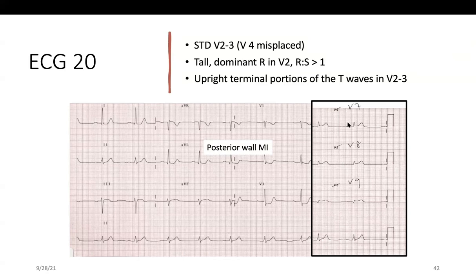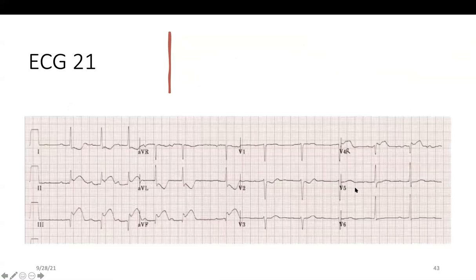And when you do the posterior leads, look what you see. There is ST elevation in V7, V8, and V9. So this is a posterior ST elevation MI.